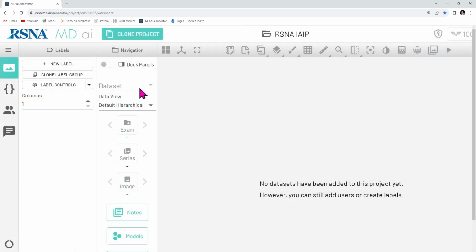Okay, so throughout this demo, we've seen several different AI tools. So how do you decide which tools to procure for your practice? This is where MDAI can help. MDAI is a cloud-based annotation and model validation platform. Users can securely manage and annotate their imaging data, deploy models, and review model predictions in a collaborative way.